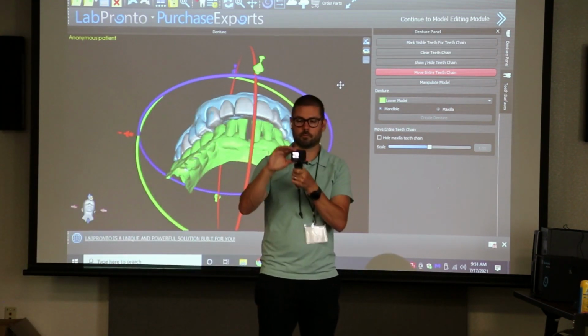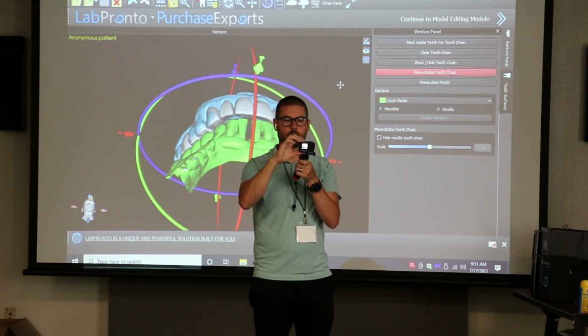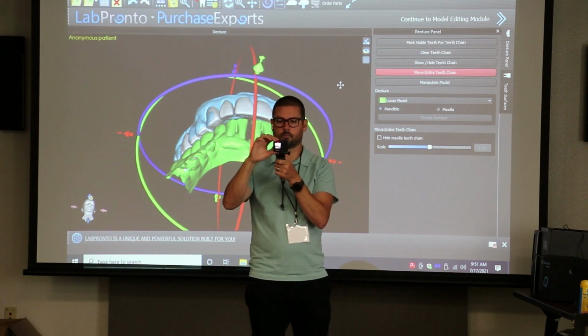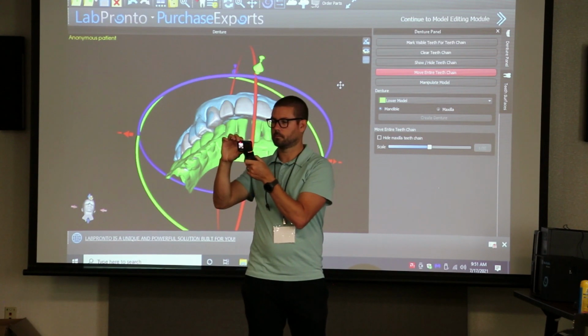No, I did the fly. Oh, you did? Yeah. All right, how are you doing? Did you get your teeth in there? I messed them all up. Okay. So I just started over. Yep. Select all. Perfect.